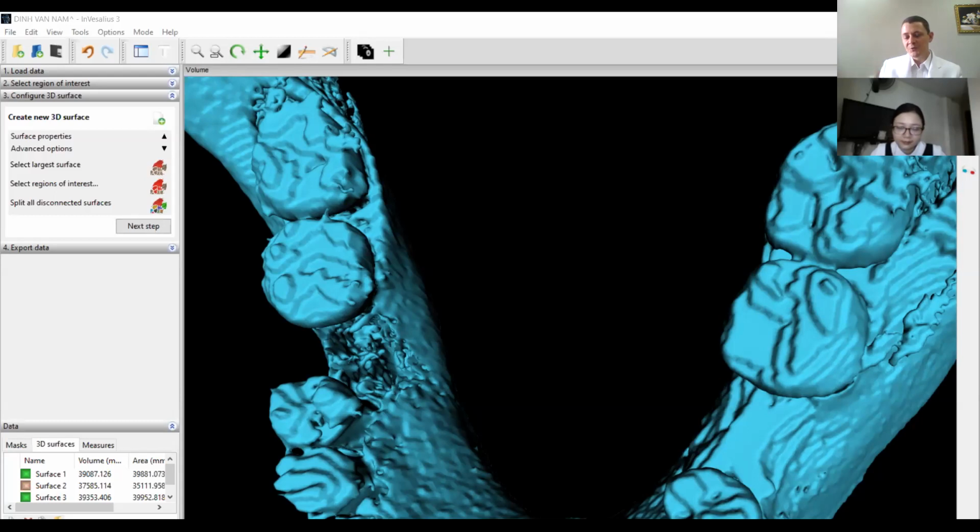Okay, so I think it's all for today. If you want to train, you have two CBCT. The other one, the one we did not do today, the teeth are touching. So you have to erase the maxillary teeth where they are touching the mandibular teeth so that you have a separate object. That's the difficulty. If you want to play, you have the file and the software, try to use it and you will see it can be very useful for work.